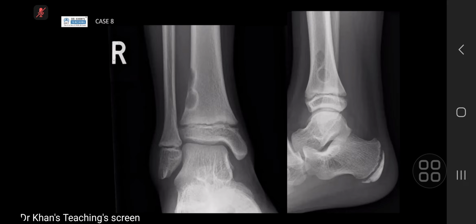Okay, good. So we'll come on to osteoid osteomas later. But you nicely described the non-ossifying fibroma in this distal tibial metaphysis. They tend to be long lesions, eccentrically placed. And this is a nice example of what's described as a bubbly lucent lesion.